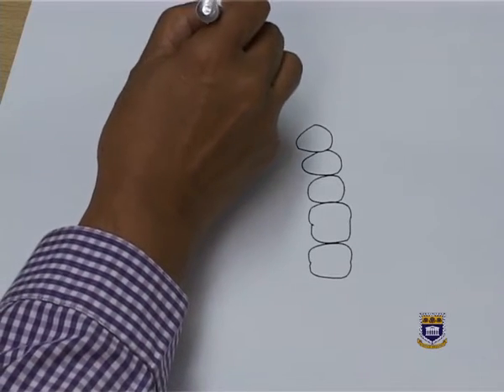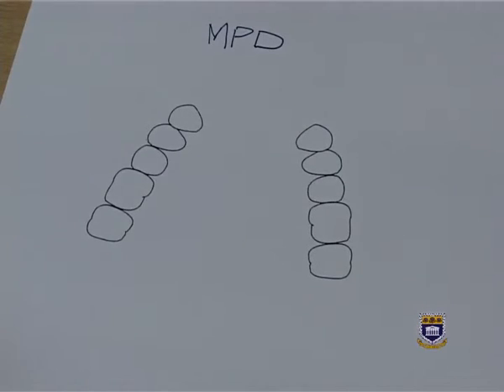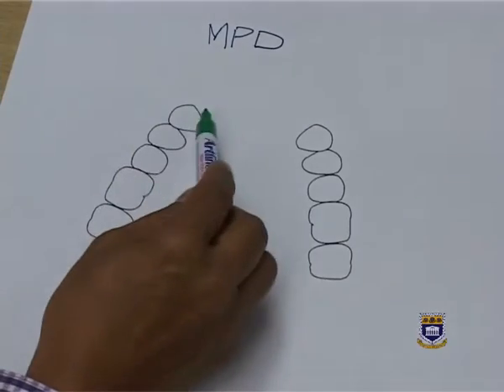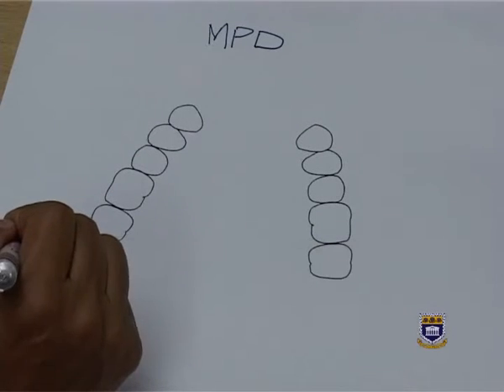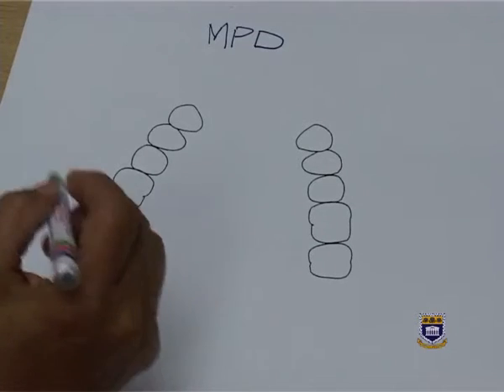So for this design, we will do a metal partial denture, and we will follow exactly the same 7 steps. Always say that's the 7 steps to heaven. The first step is that we have identified, we've surveyed our model, we have drawn the teeth that the patient has. It's a class 4 partial denture again that we design, a metal partial denture.